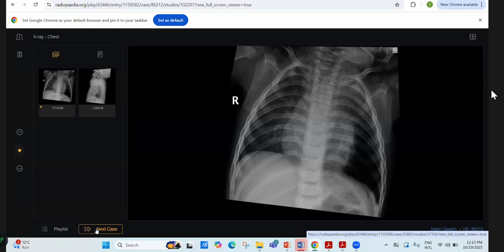Patient presented with sudden onset of cough. I've been presented with a frontal chest radiograph of a relatively young patient demonstrating mild haziness in the left upper zone as compared to the right side. I can see the patency of the tracheal lumen.